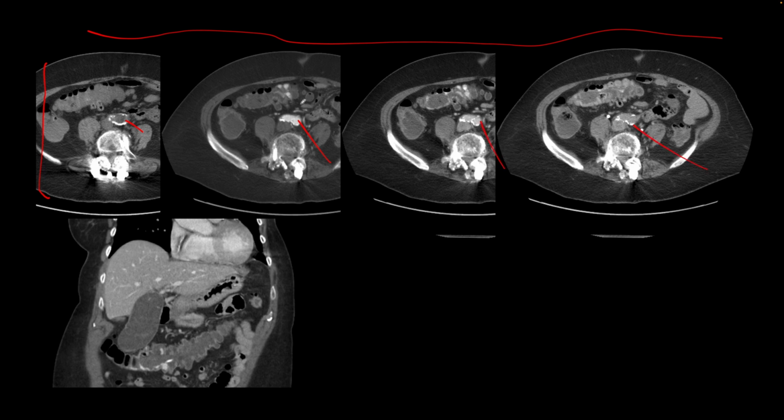We see that in the arterial phase, there is contrast extravasation involving the transverse colon, and then that dissipates inside the lumen, and then there is more bleeding. And so because in that region we see extensive diverticuli, this is probably a diverticular bleed occurring in the transverse colon. And so now you can call the interventional radiologist and tell them that they are bleeding from a diverticulum in the transverse colon, and you need to go catheterize and inject the superior mesenteric artery to find the bleeding and to occlude it. Here is a representative coronal image showing the same finding.